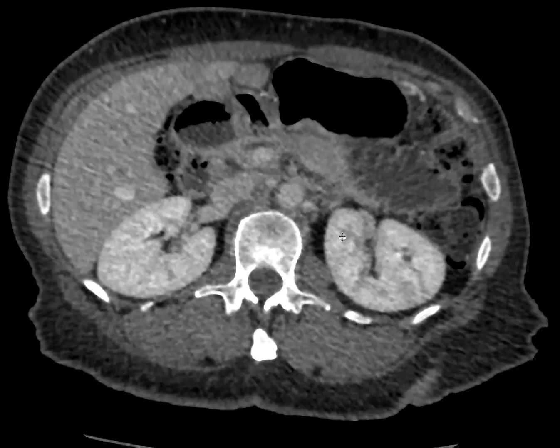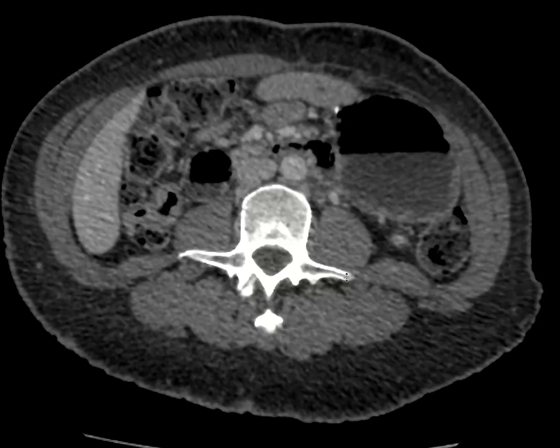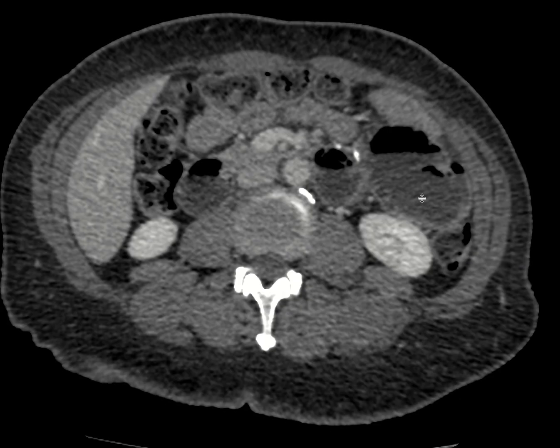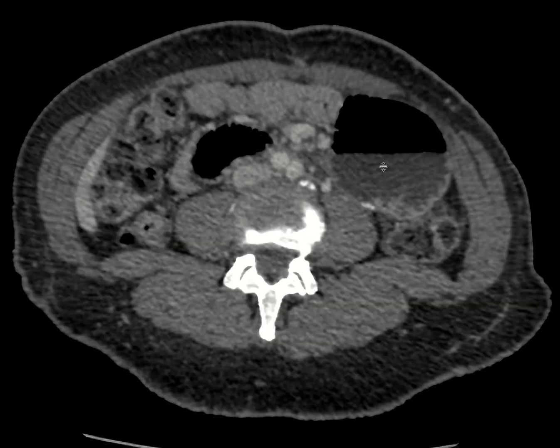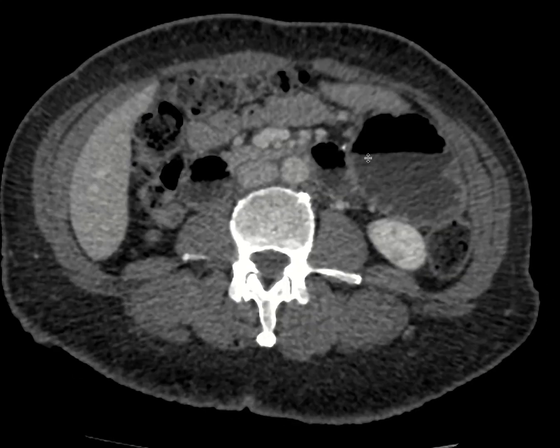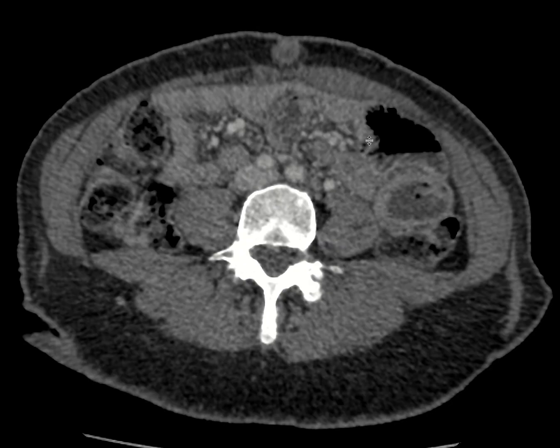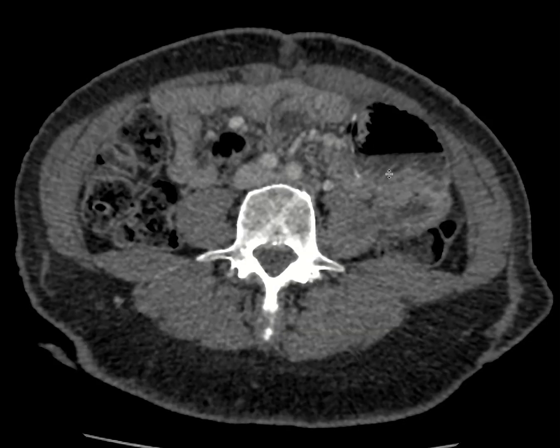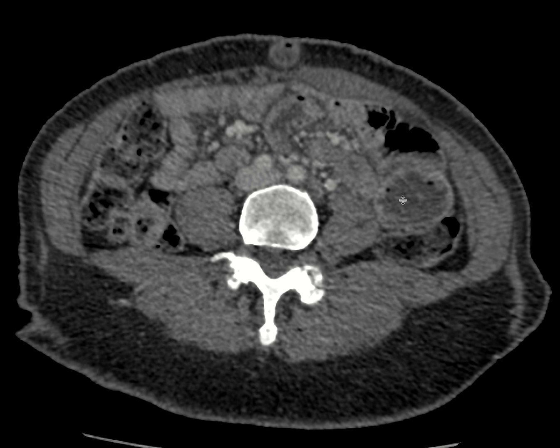And the thing that I wanted to point out in this particular patient is we can see that there's a dilated jejunal limb right here. This is actually the efferent limb that's coming down, and we can see the staple lines here. That's usually your jejunojejunostomy, and so you can actually see a loop of jejunum, which is your afferent limb, coming into the efferent limb, and then coming down here and feeding the distal portions of the jejunum. And so this is your gastric bypass.